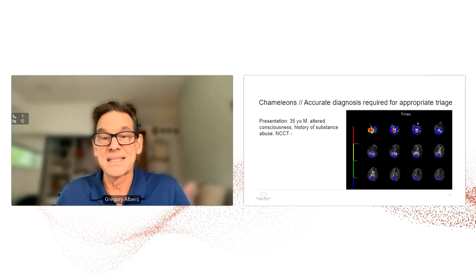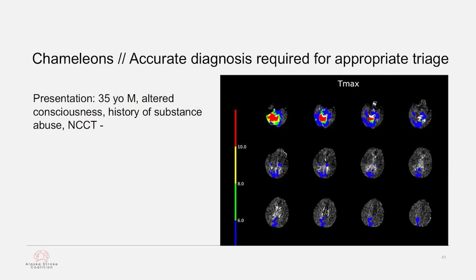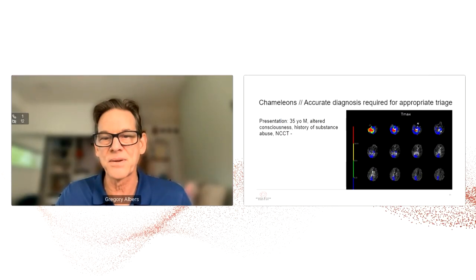And it is easily made in the vast majority of cases with CT perfusion. This patient has a clot in the basilar artery. So this is a basilar artery thrombosis. And we know that we can have very effective treatment responses by pulling these clots out. And here, seeing the pattern of abnormal blood flow in the cerebellum and brainstem can be very helpful to tip you off that you're dealing with a basilar thrombosis.